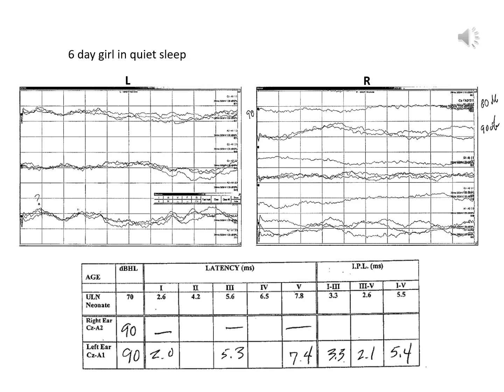And so another important piece of information that we see on these tracings are the numbers 90 for the left ear and then 80 and 90 on the right ear. And so what this tells us is that the technologist probably started on the right ear with 80 decibel stimulation and saw nothing. And so they only did one recording, and then they moved immediately up to 90 decibels and did 2 replications, and again there was nothing, and so they stopped there.